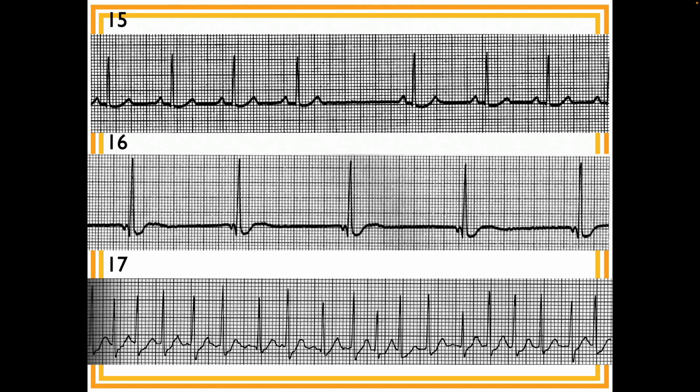Is it impossible for it to be MAT? No, it's not impossible. On the other hand, it's more likely to be atrial fib. And what you're seeing are not P waves, but just the normal junk that accompanies atrial fib, the isoelectric line.